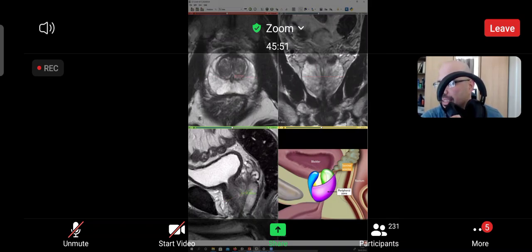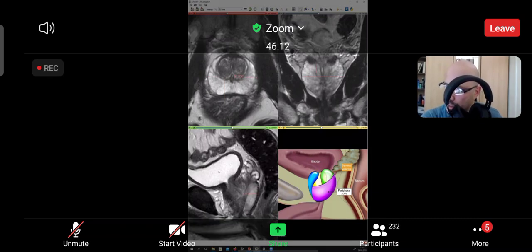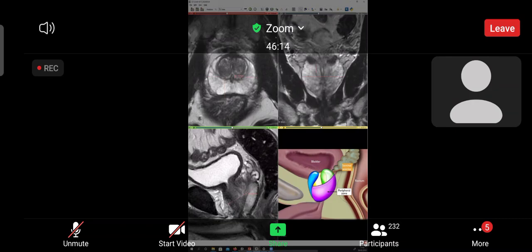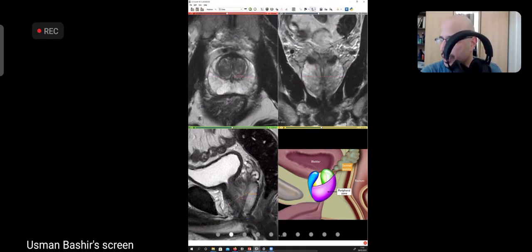So I roughly go just a little below where it is at its base, and there I get this measurement, and I align it at a right angle to the urethra. So the urethra, notice it's going through like this. Okay, I hope this is clear to everyone कि urethra यूं नहीं जा रहा, यूं भी नहीं जा रहा, it's oblique, right? Yes. और ये आपका जो है ना, ये plane होगा फिर. Okay, so ये cross, this has to be a perfect cross.